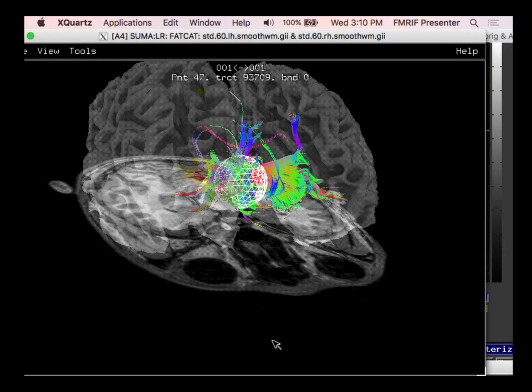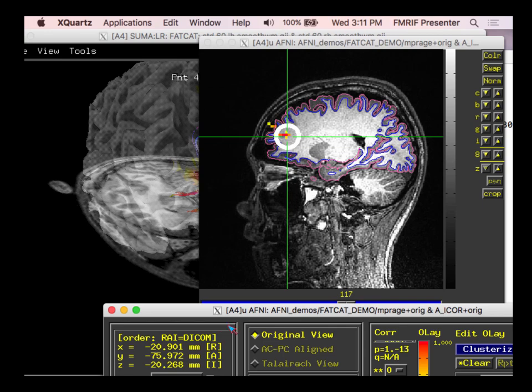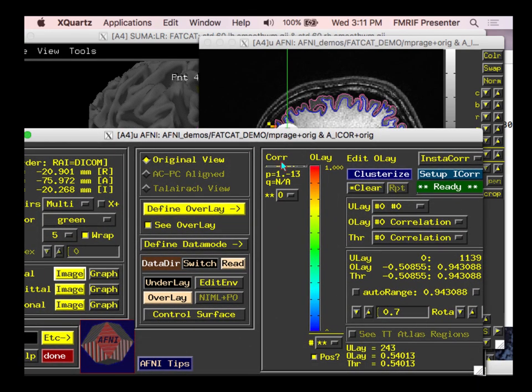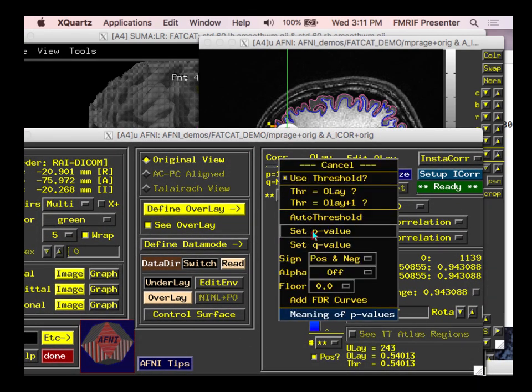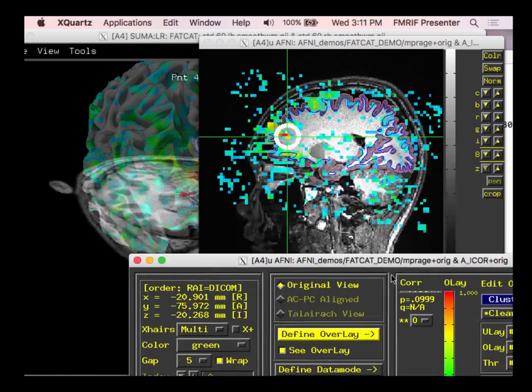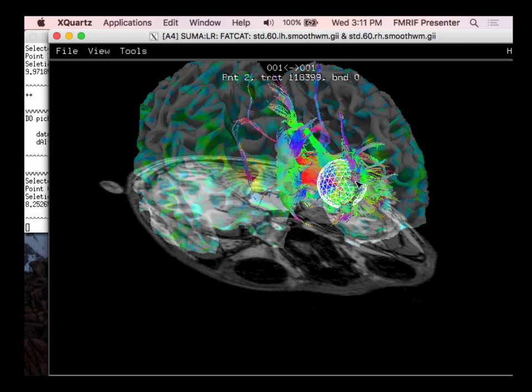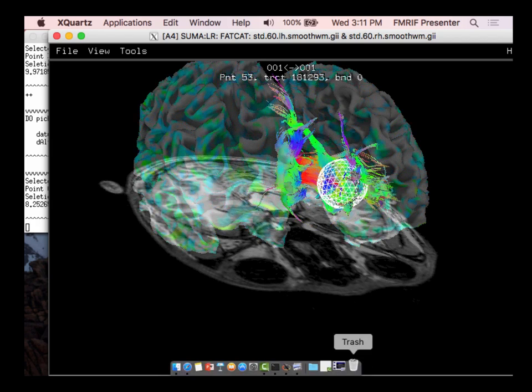Are there any questions on that? Okay, so that's been a brief tutorial of, set the threshold low. Maybe this is a little easier. It just shows a bit more. Okay, so between Bob and my talk, you're all masters of brain imaging and visualization now, so congratulations.